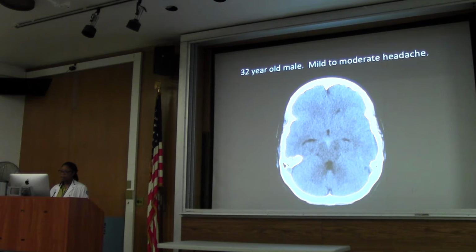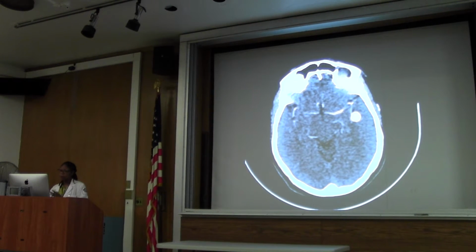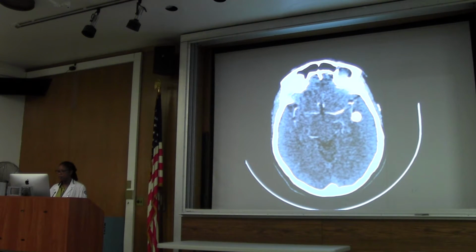So that's an aneurysm that's occurring in one of the middle cerebral artery branches. Okay. So take home point: see subarachnoid hemorrhage. The most common cause is still going to be trauma. But if the patient doesn't have a history of trauma, then you have to exclude the presence of an aneurysm, followed by a CTA. If the CTA is negative or positive, the patient should still get a conventional angiogram.